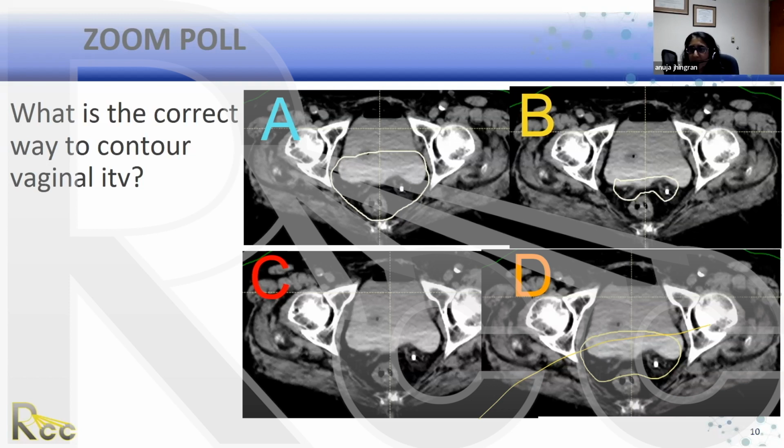So you guys know what I'm talking about, right? Exactly. D is the right answer because we've already talked about not carving out the rectum, right? This is covering the rectum. The reason why this is wrong, but again, this is what I see as big mistakes when I'm reviewing charts for other physicians and even my residents, right?